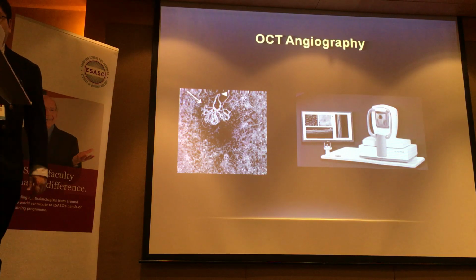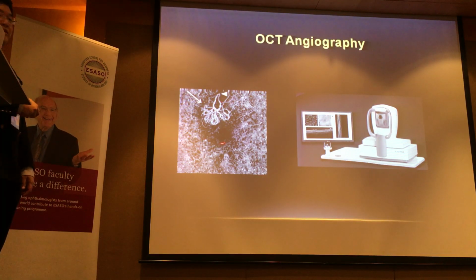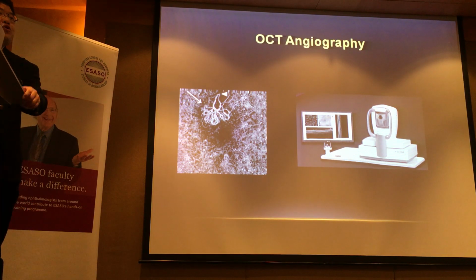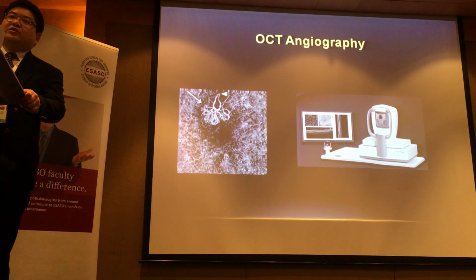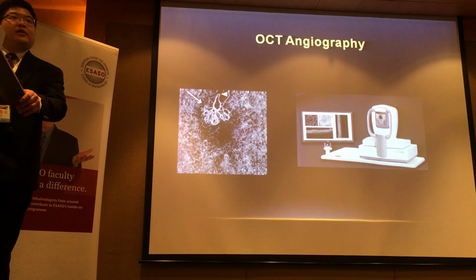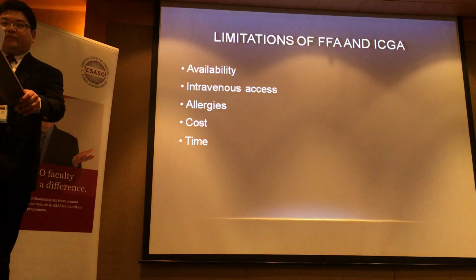So OCT-Angiography, if you were to look at this at first glance a few years ago, you would have guessed that this was an angiogram, perhaps a fluorescein or indocyanine green angiogram. But no, this is performed just using OCT. There's no dye injection, you just use the OCT instrument itself, right? And so this is what's exciting about this.